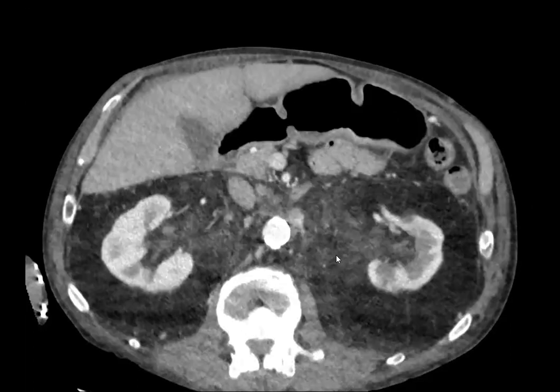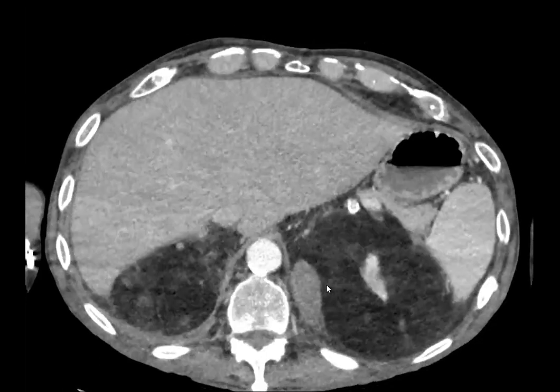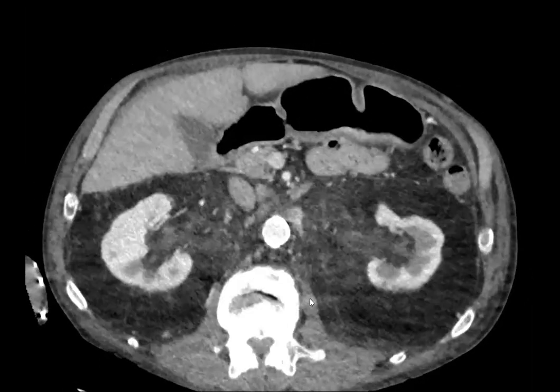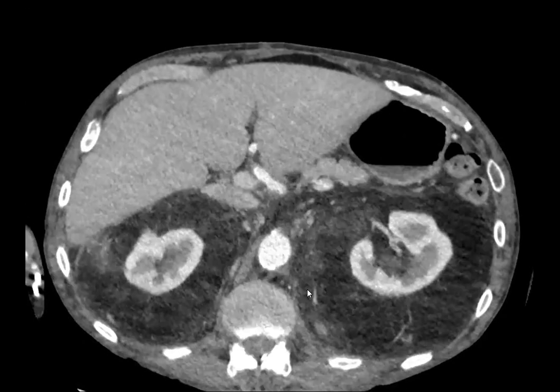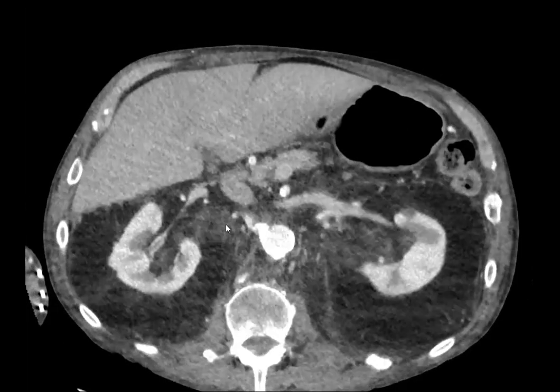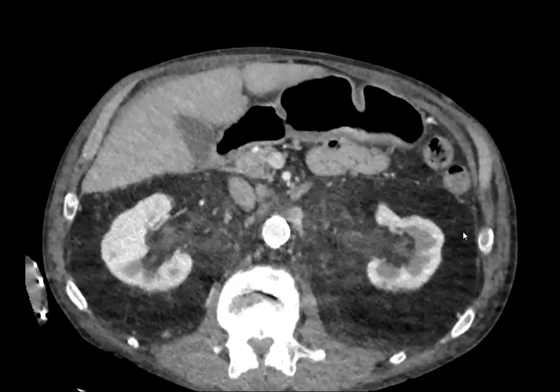So what's your differential for soft tissue that's predominant in the perinephric space, but maybe also associated with other soft tissue, paraspinal soft tissue masses? Retroperitoneal liposarcoma. Okay, so you're thinking about a liposarcoma. Good. I will say it's usually not bilateral. It often starts on one side. It could have smudgy soft tissue in it, but usually it's a more encapsulated mass with both fat and soft tissue, usually starts on one side and pushes everything forward. This is more infiltrating the entire space here and is bilateral.